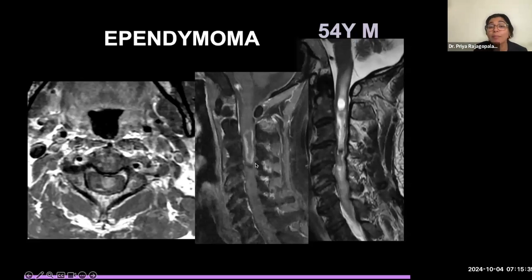And here in the bottom, there is that hemosiderin cap that we just talked about because of that hemorrhage. It formed a nice cap in the pole. It formed only in the lower pole in this case. And here's some blood spinal cord barrier breakdown, and there's that enhancement associated with the tumor.